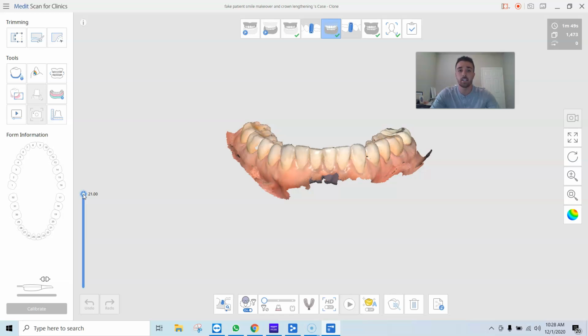The disadvantage is if retraction is difficult with the patient, then because the camera can see farther, it's also going to catch more artifact like cheek, lips, gloves, and tongue.